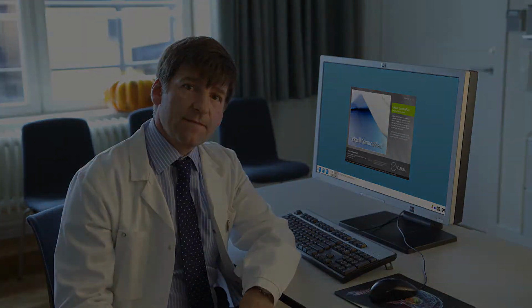In this video, I'd like to show you how easy it is to produce conformal high gradient treatment plans using Leksell Gamma Plan. Once you get used to the system, you can quickly construct multi-isocenter treatments to cover even the most complex of targets. I'm now going to demonstrate how I'd make a conformal treatment plan for a vestibular schwannoma.